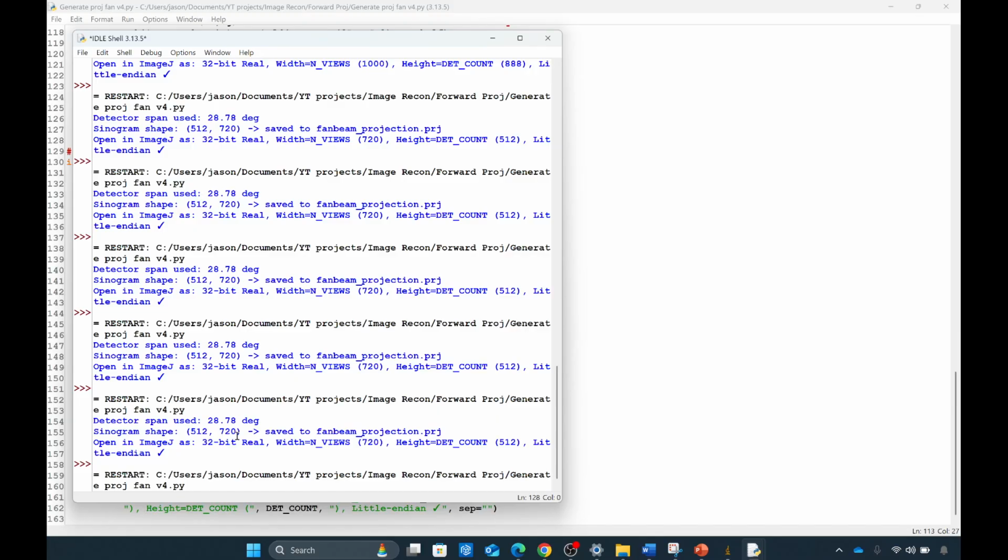One note is that the way we are coding this right now is educational, and it runs entirely on the CPU, looping over detectors and views. In real CT research, this forward projection is highly parallel, so we can often accelerate it using a GPU algorithm. That's how you get from minutes down to seconds.